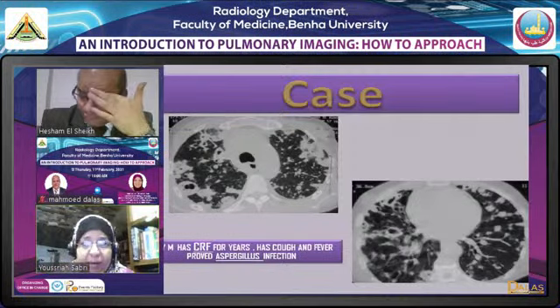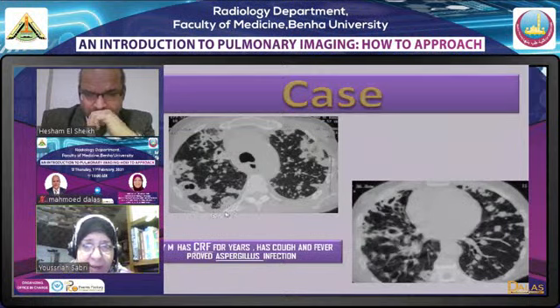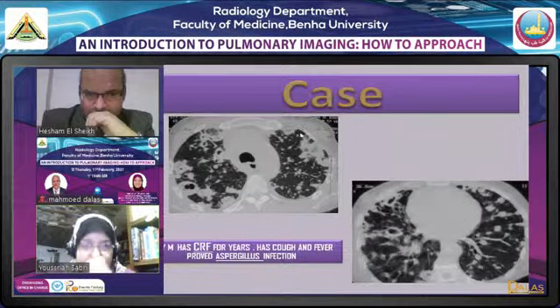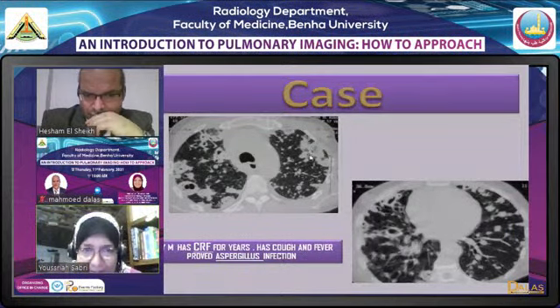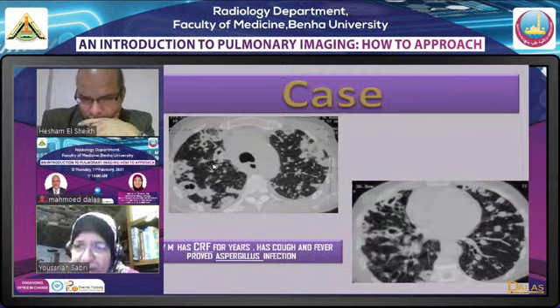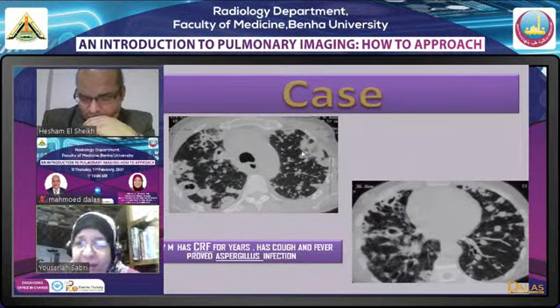طيب لما الاقي منظر زي ده كده، يعني بصوا حضراتكم على الصوره اللي على الشمال، بصوا الكافيتي شكلها عامل ازاي، بصوا على الليجن في اللنج الشمال في الصوره اللي فوق، ايه المنظر ده؟ بيزار ابييرنسز كده، وكافيتي شكلها غريب وليجن شكلها غريب. ده المنظر اللي بيسجست ان ده انا بتعامل مع حاجه اتيبيكال انفكشن. تمام؟ يبقى ما هياش نودولا بنت ناس، ولا هي كافيتيتنج نودولا بنت ناس، ولا هي باتشي اوباستي عاديه، لا.